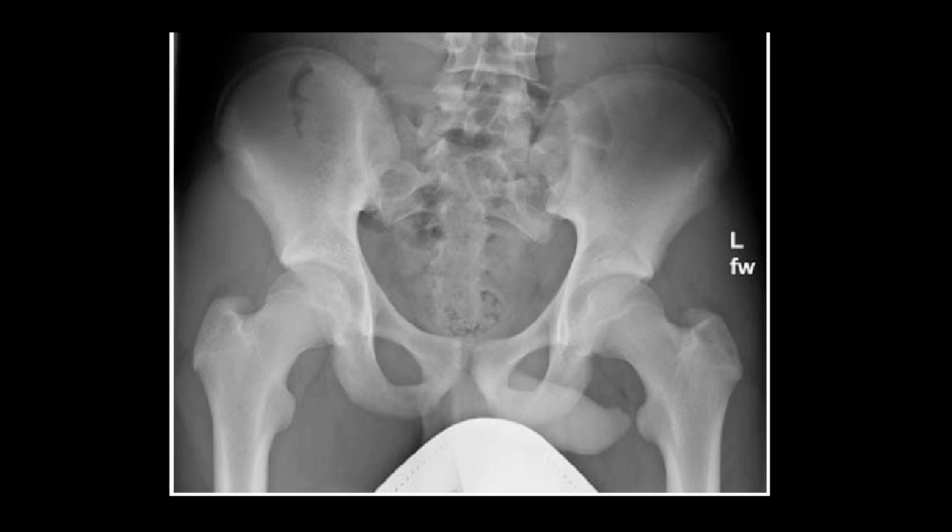Now we have our first x-ray to look at, and again, we're just going to approach these using the principles that we've gone over, so with the ABS system. And I want you to pause the video here, see if you can work out what's gone wrong with this, and we can resume after.